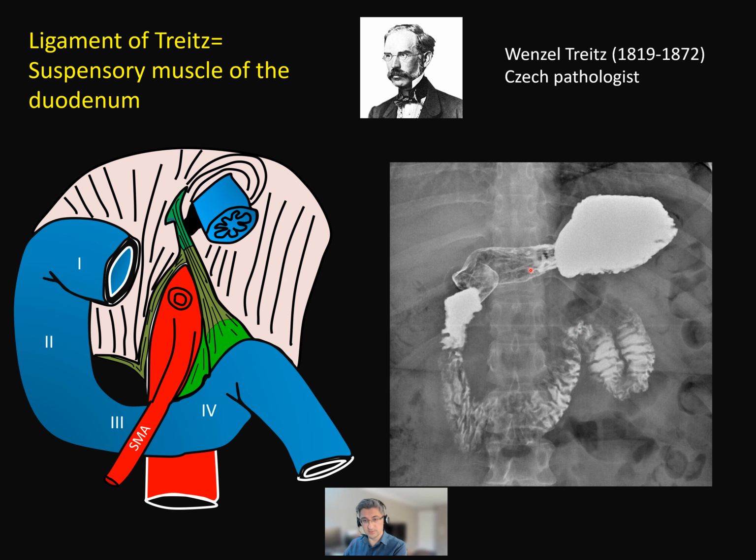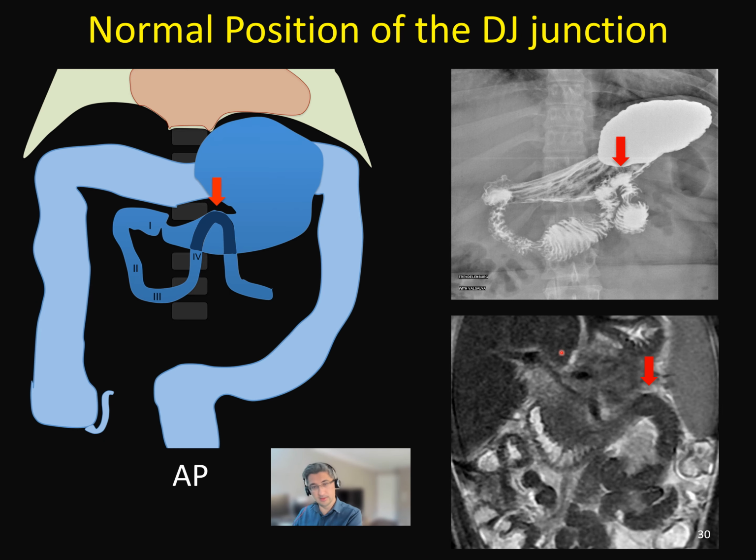The normal anatomic position is here at the level of the pylorus and left to the pedicle of the vertebrae. And here you can see the attachment.